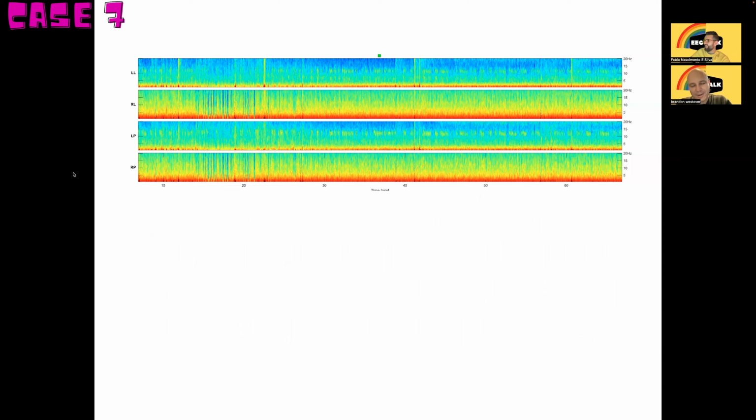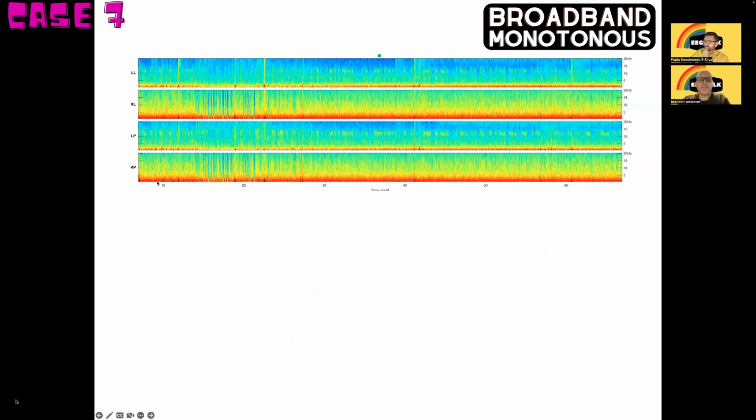Narrow band. Actually, this is broadband monotonous on the right. LPDs. Okay. Although actually, here, the band, you might ask, is it really broad? I would say it's pretty borderline, but I'm still going to go with broadband monotonous LPDs. I just bet that they're a little bit blunter than the other ones we've seen. We don't have a cutoff to call it broad or narrow, do we? I've been using 5 hertz. Okay. Got it. Okay, cool.